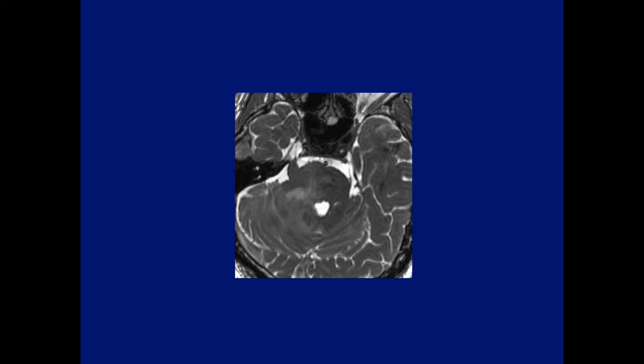Gino mentioned the involvement in the region of the nucleus. So the pons is involved. What else is involved? Correct. There's marked enlargement of the right trigeminal nerve in the cisternal portion. Notice it gets small when it goes to Meckel's cave.